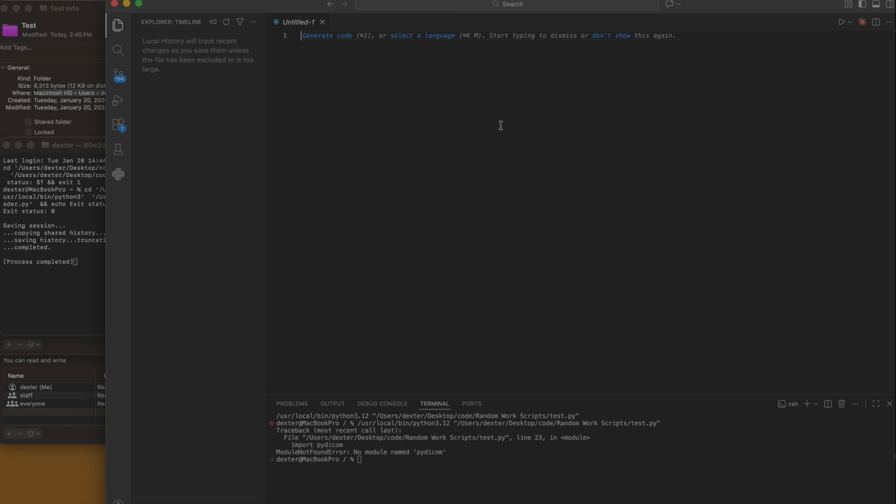So first things first, like all Python programs, we're going to start by importing some libraries and some other useful stuff. Since we're going to be taking things from the system, like file paths, and saving things to the system, we want to import sys. Next, we want to import the workhorse of this program, which is Pydicom. This will allow us to open the DICOM file, as well as read it and do interesting stuff with it.